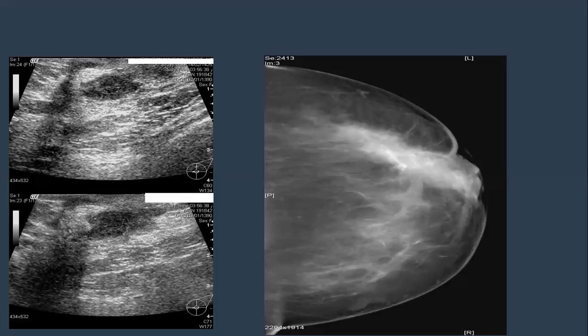So it's going with sclerosing papilloma also. Why is it a sclerosing papilloma? Why would the sclerosing papilloma present by discharging pus? You have distortion, you have band-like densities with adjacent skin thickening and pus nipple discharge.